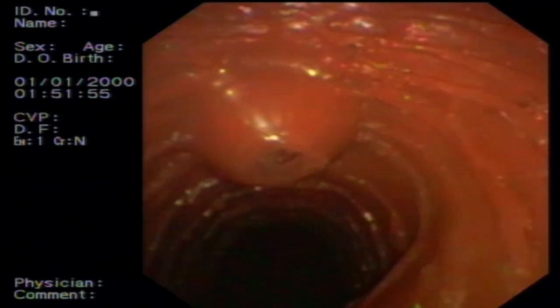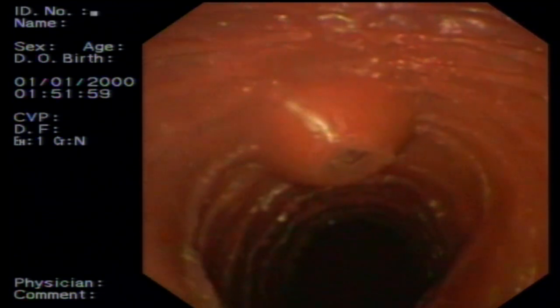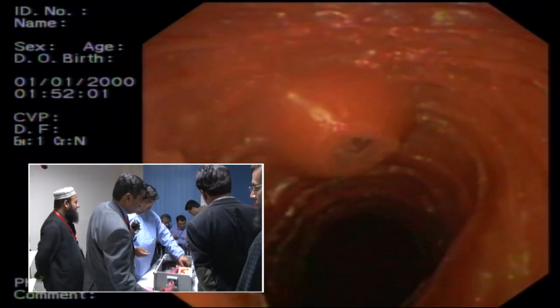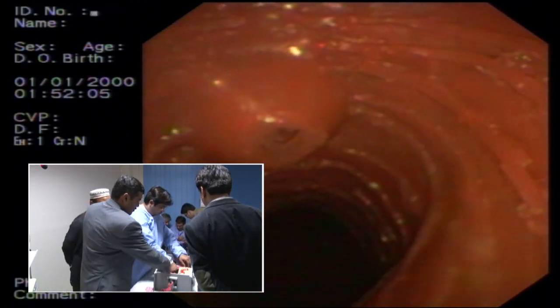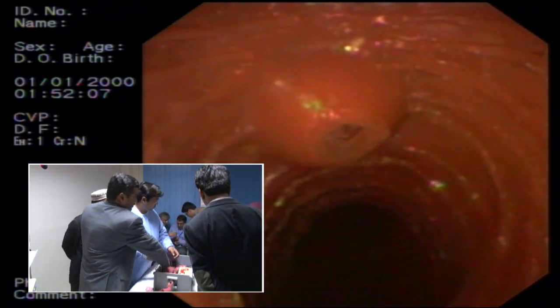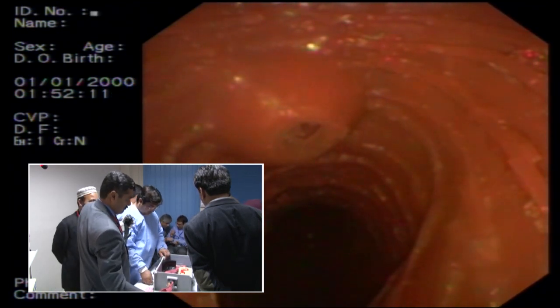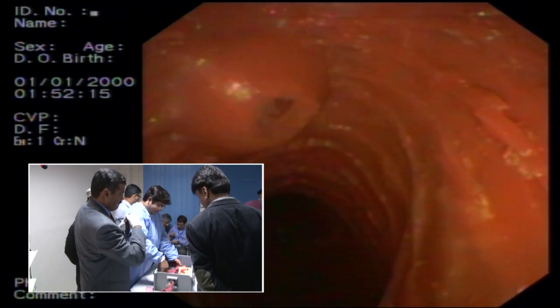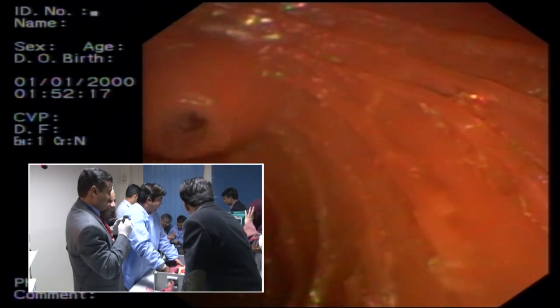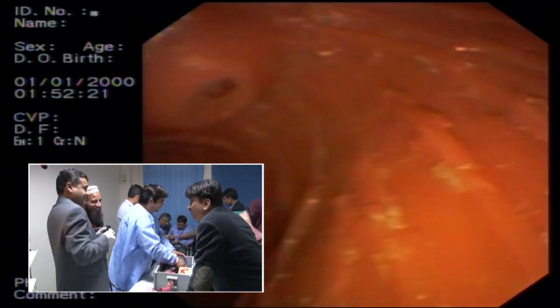Is the 3 French. There's one which is left in there. No, the thinnest one is the 3 French. No. French is this. Look at this. That is 3 French. No, there's nothing smaller than 3 French. So then you see this is 5. This is 4. This is 4. And that is 5. 3, 4, 5. And you have this is 7.